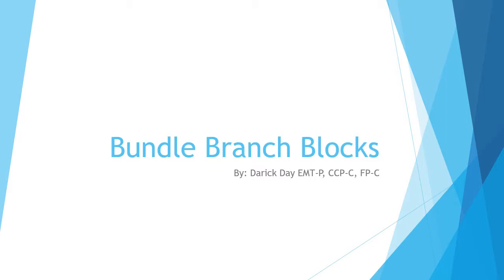Is this VTach? Is it a bundle branch block? So hopefully after today, this will help you be able to somewhat determine the difference. You can't ever be perfect when we're talking about diagnosing VTach, but we can get you a lot closer.